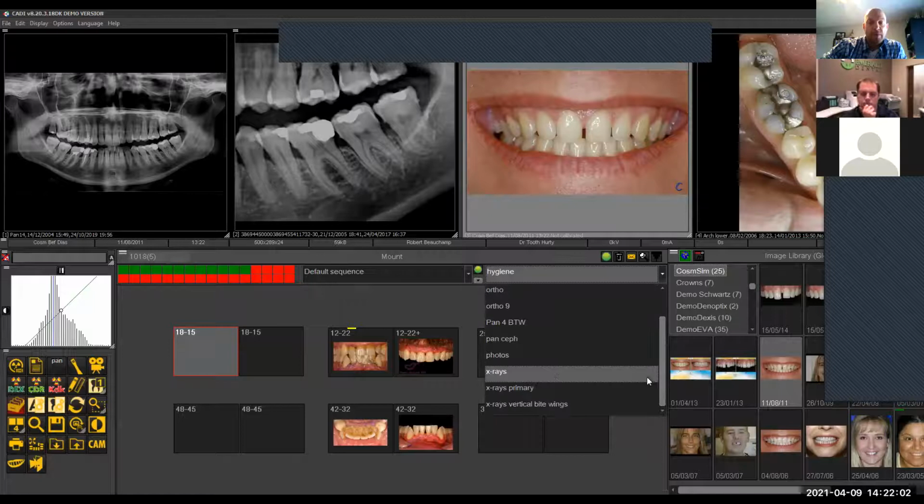It's not part of the full, because the companies that came out with the 3D machines initially were charging a per station license, and an expensive one. So we decided to program a 3D viewer with limited capacity, because the software you have when you're doing your diagnostics and looking at all the treatments comes with that product, and you have the best software for that product.